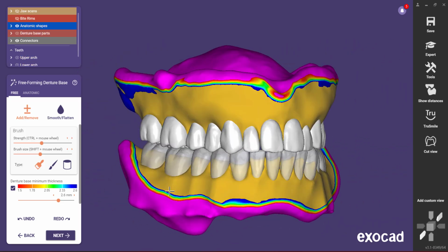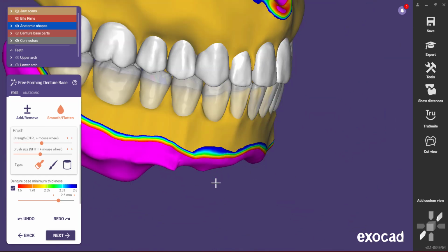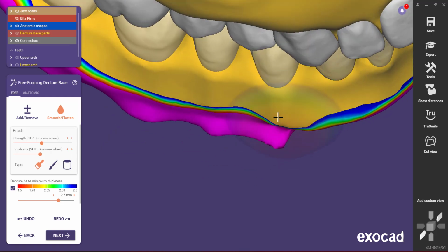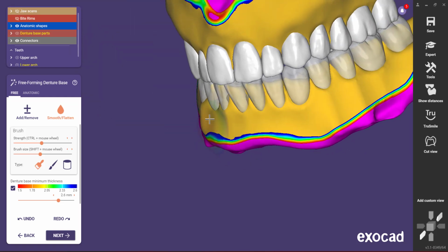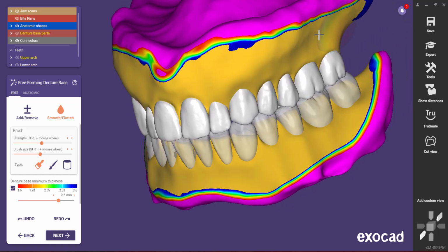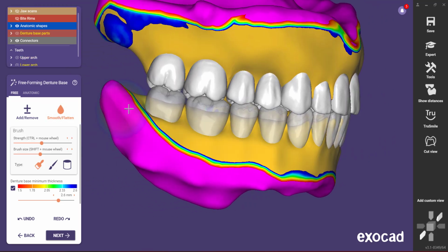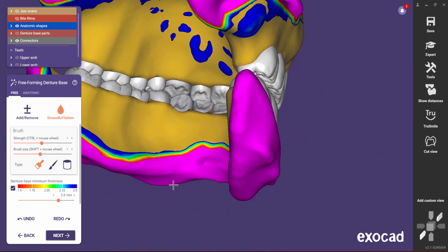So I'm pretty happy with that. I'm going to go around and smooth. The gingival proposals in Exocad are pretty decent, but you do sometimes get these real angular root prominences that I'll just go back and hit with a smoothing tool. Because as much as we dentists like to put in gingival anatomy on a denture, pretty much every patient I've ever put those on, they look great in pictures, and the patient's like, "Hey, smooth all this crap off because it's rough to my tongue."